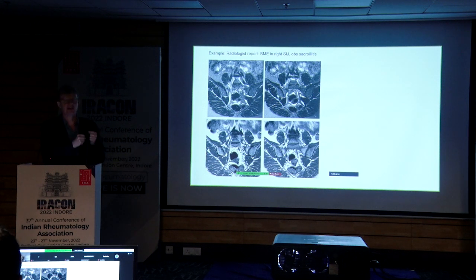And if you only read that report, then you have a challenge, because then you would say, okay, well, perhaps this is sacroiliitis, and perhaps it's actually SpA, so we probably should call it that. And first of all, these changes are too small. This is unspecific. It's the anterior upper part. It's unspecific. That's one thing.